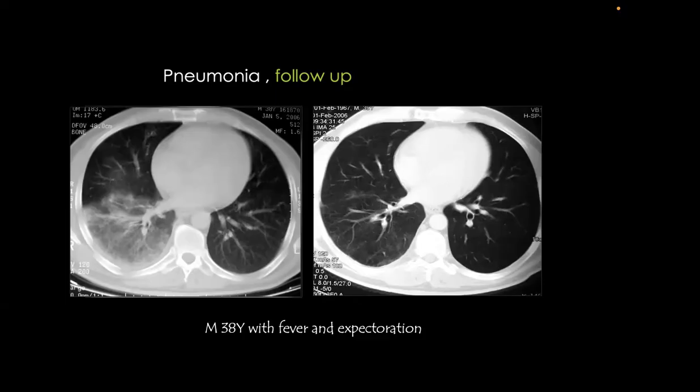When he's brought back to the hospital and we do the follow-up radiograph or the follow-up CT scan, you might find things like this, and the patient is very well. So in this situation, we tell the patient there is usually a lag of the radiological improvement behind the clinical improvement. The patient clinically gets very well and radiologically is still having findings or opacity. And very importantly, as we were taught by our great teachers in the Faculty of Medicine, treat the patient and don't treat the image.